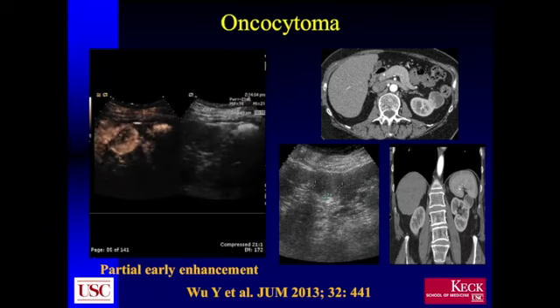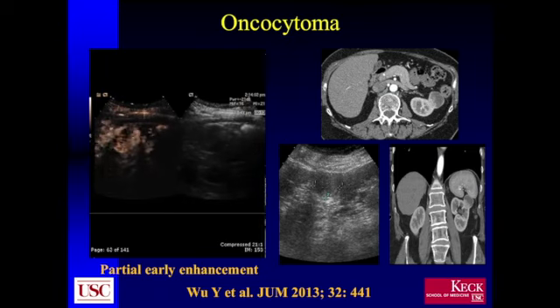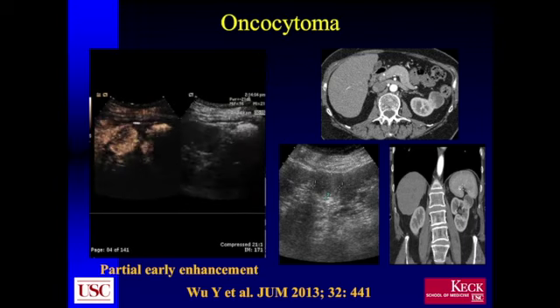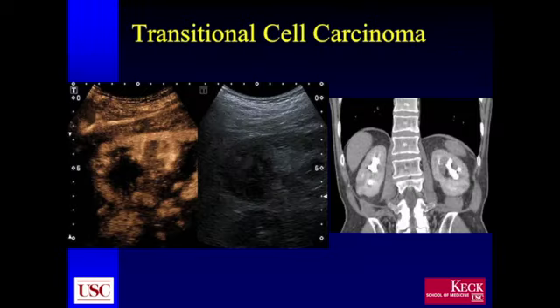I do think that I've probably never seen a renal cell carcinoma that had that kind of yin-yang appearance, and this one did, in fact, turn out to be an oncocytoma. So kind of an interesting finding. Again, I'm not sure that I would hang my hat on trying to make a definitive diagnosis by imaging of any kind when it comes to oncocytomas.